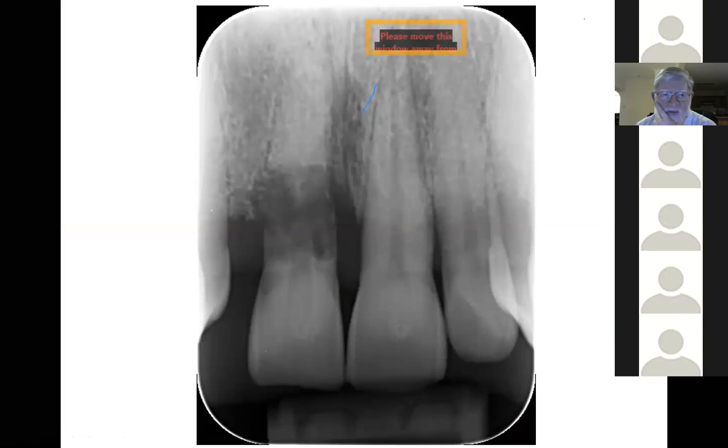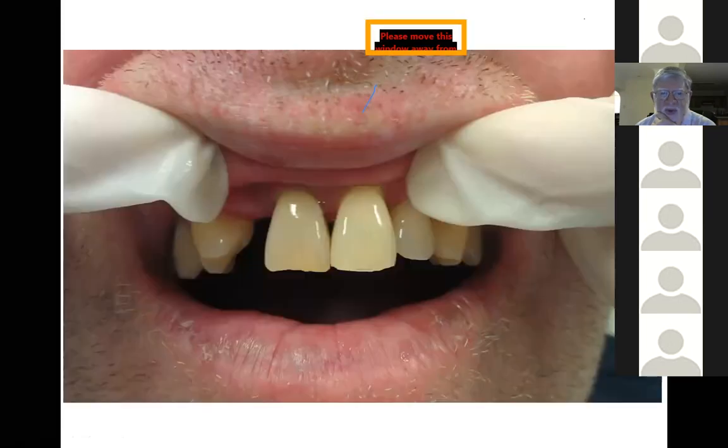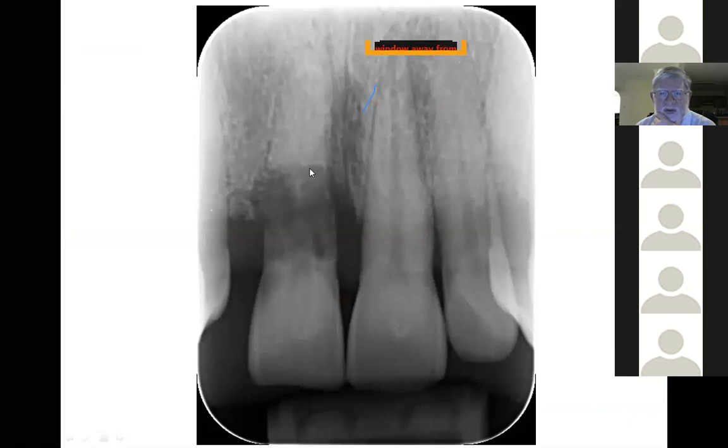And of course the discussion here is going to be looking at a good long-term solution, whether we use any orthodontics to close some of the spaces there. We're looking at an implant or a removable denture, whatever the patient wants. He's got to decide between removable appliances or fixed appliances for that.